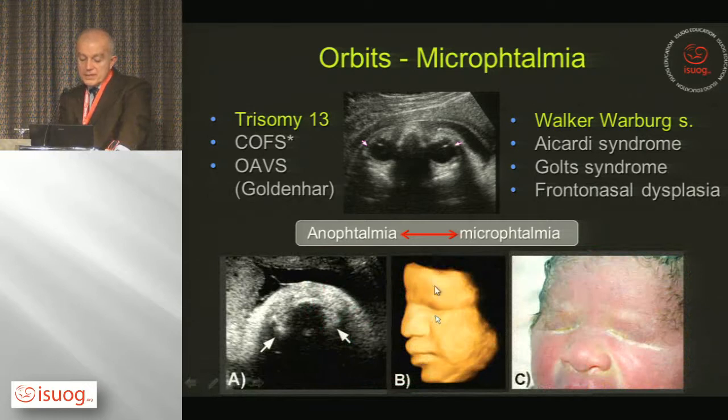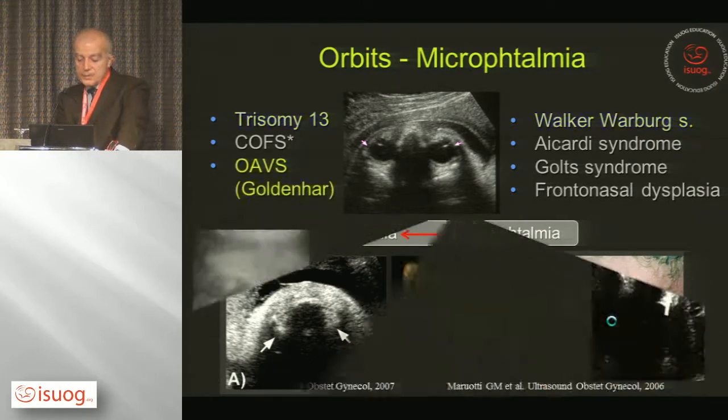same time. And this is a late diagnosed case in which you have an anophthalmia in a fetus which is quite normal for the rest of the baby. And don't be misled by the normal baby facing, because unfortunately in this case the mother had a lot of pictures with a very nice image of the face, but the operator unfortunately was not able to detect that the eyelids were actually sealed because there was no eye bulb inside, no eye socket inside. And this is the poor neonate at birth.